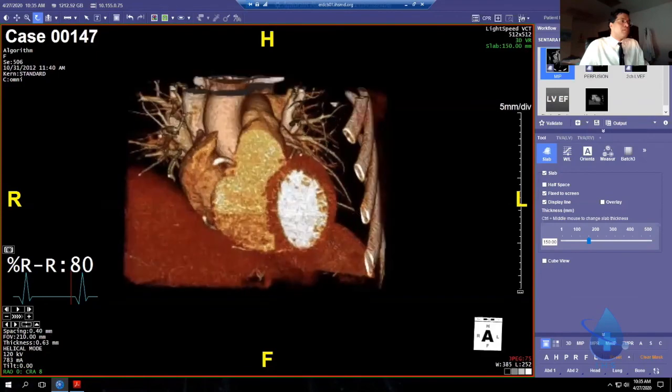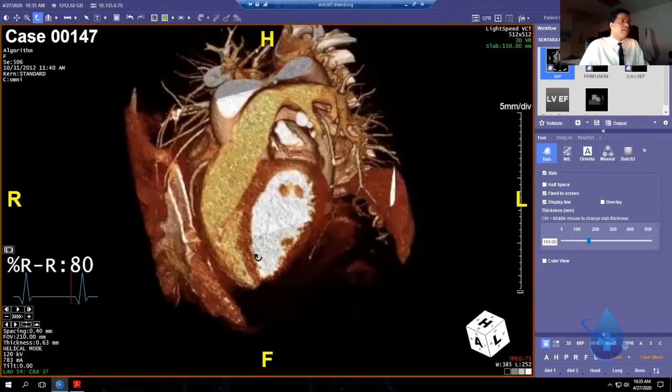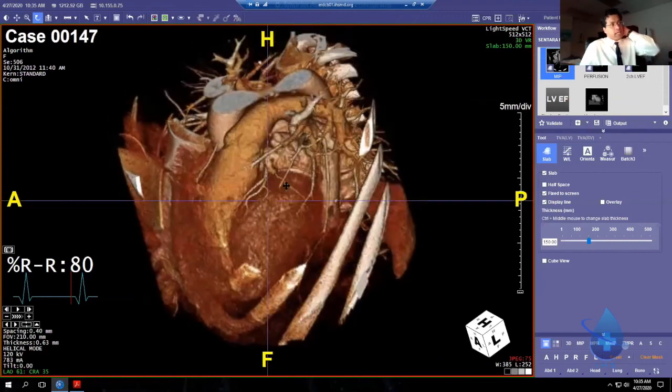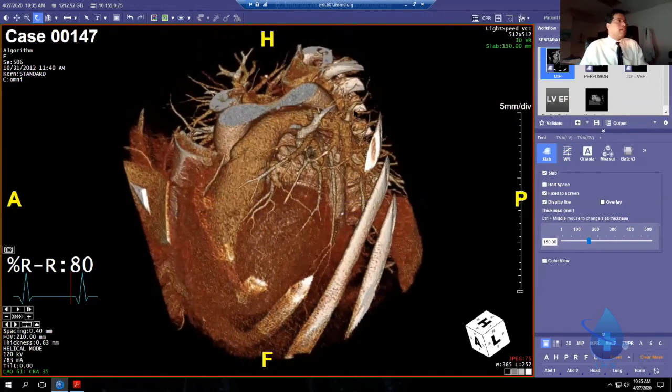All these manufacturers of software have created very, very busy workstations. And I think one day there's going to be an AI algorithm that's going to intelligently say, look, if a doctor hasn't touched any of these extra buttons in 90 days, it should just disappear from the graphical user interface. But for now, we're stuck with the buttons that are listed here.